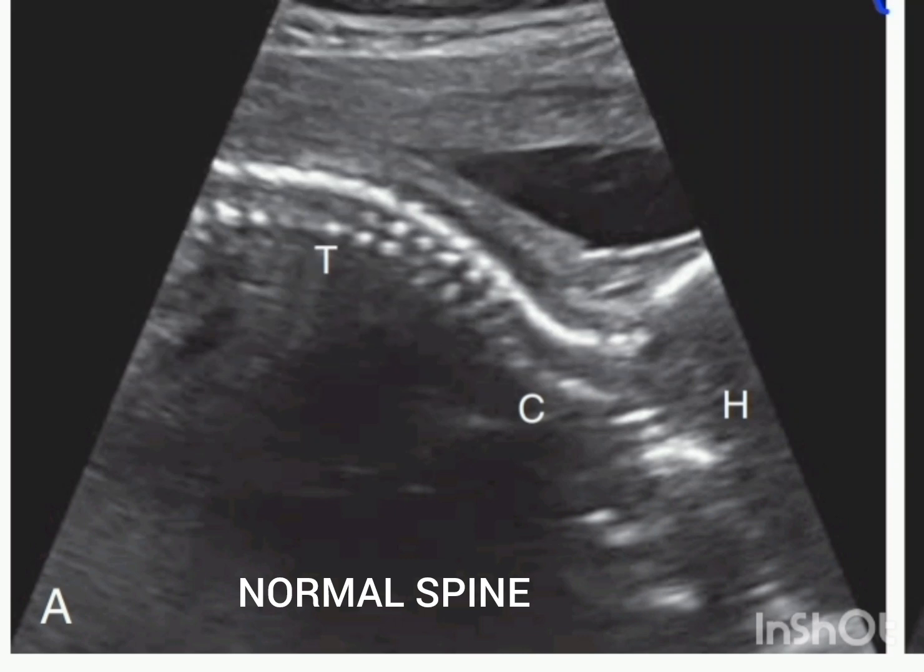Hello guys, so today's video is about the ultrasound of spine defects in a fetus, and it is a review from the book Requisites of Ultrasound. But first up, let's talk about the normal spine.